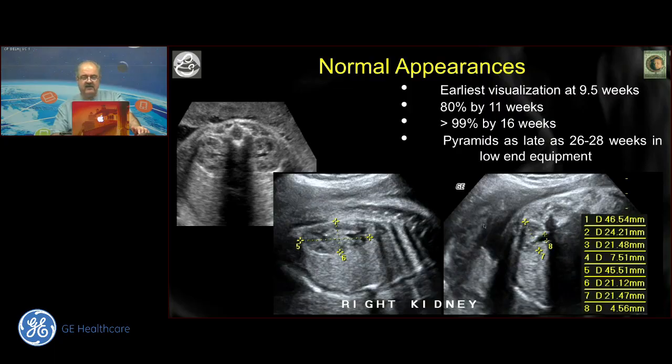And remember that although it is traditional for many of us in radiology to just measure the length and the width, it is wise to also measure the thickness of the kidney in an axial view so that you have an anteroposterior diameter as well. So the kidney should have a mention of 3 dimensions and an AP diameter of the renal pelvis.